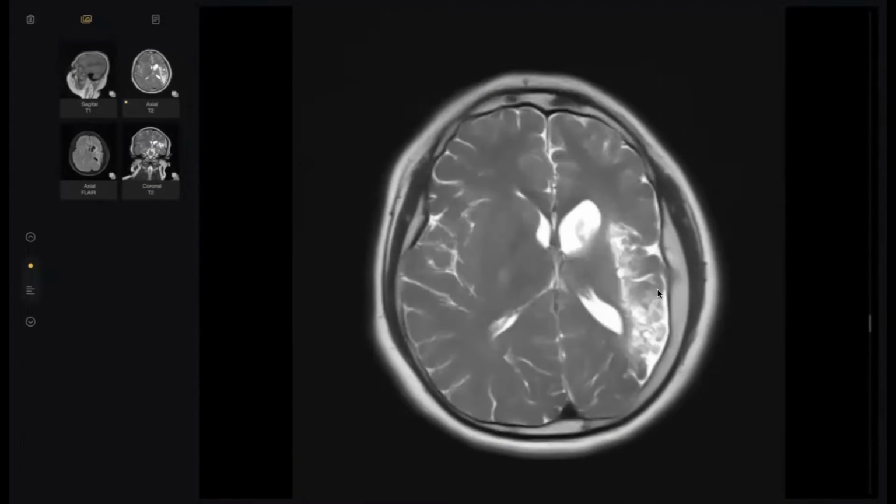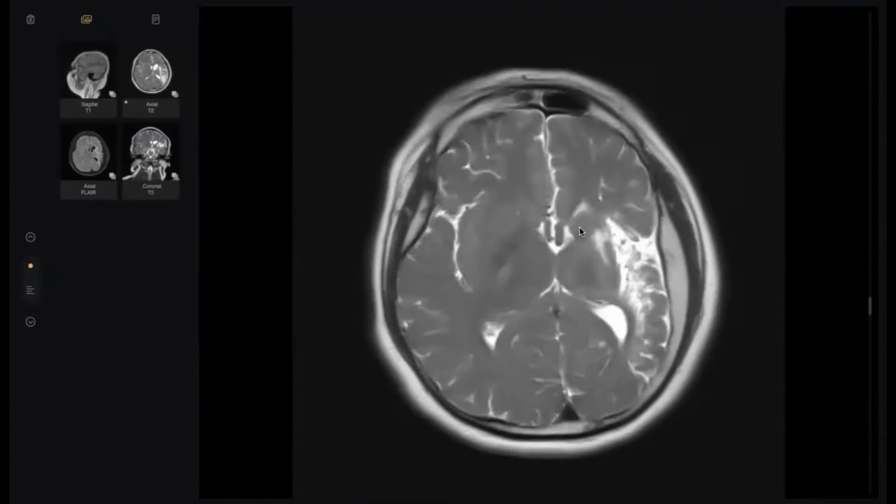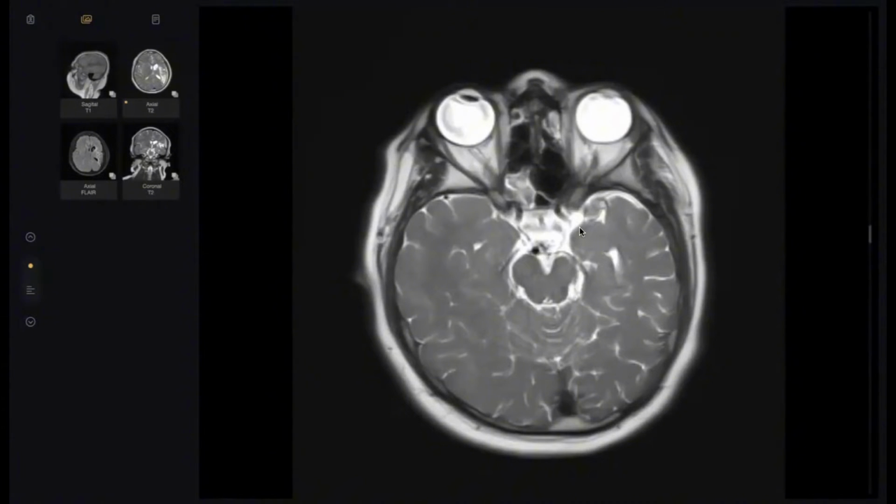I think it is very obvious for all. Associated with ventricular dilatation. All these signs affect the whole left hemisphere. So put Davidoff-Masson syndrome on top of your differential diagnosis. Then other differential diagnoses, like the doctor enumerated, Rasmussen encephalitis or Sturge-Weber syndrome.